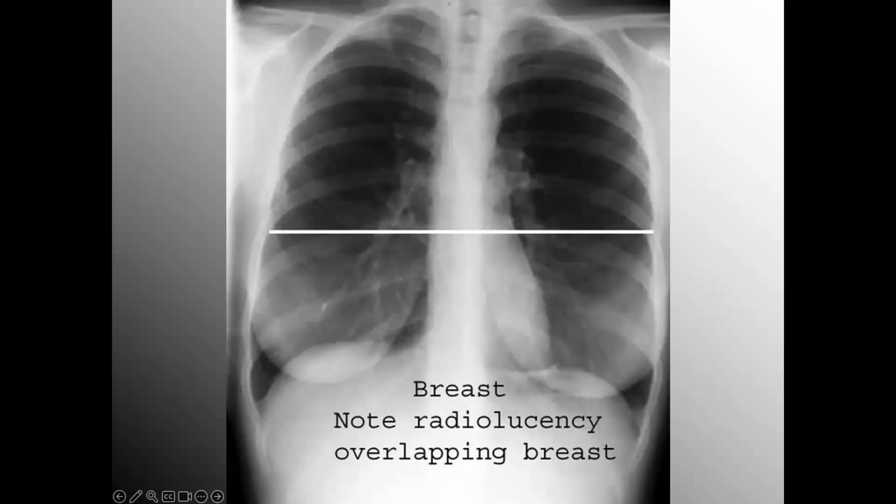Here is labeled the thoracic diameter. You would then compare this measurement to the width of the heart, known as the transcardiac diameter. Recall that transcardiac diameter shouldn't be much more than about half of transthoracic diameter under normal circumstances.